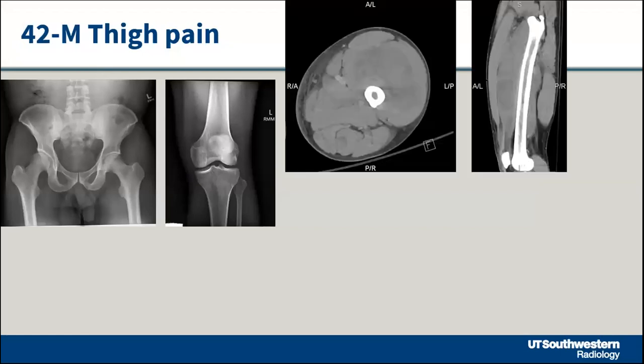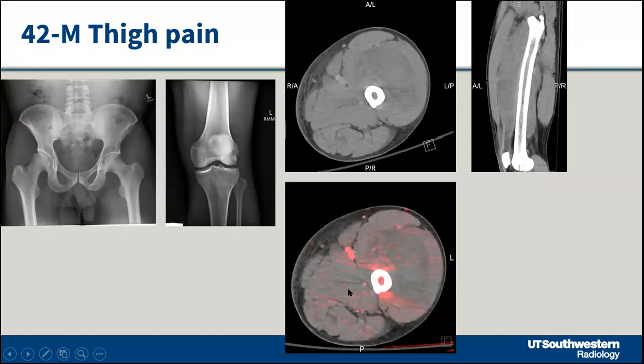Okay, here we have thigh pain coming up. This is a recent case. I think last month we saw this. So my faculty was reading, and then they saw this heterogeneous appearance. So they're worried, is it sarcoma or is it myonecrosis? What's going on? We don't know. Patient came with thigh swelling and pain. That was the only symptoms.